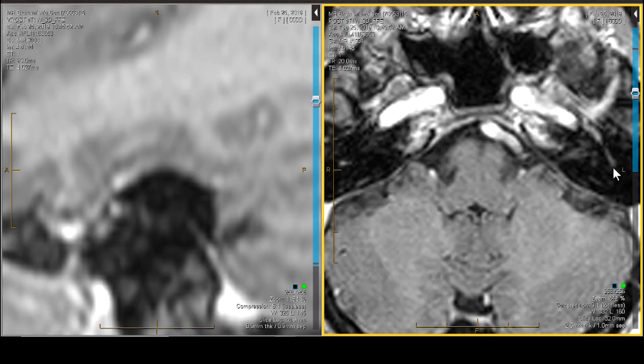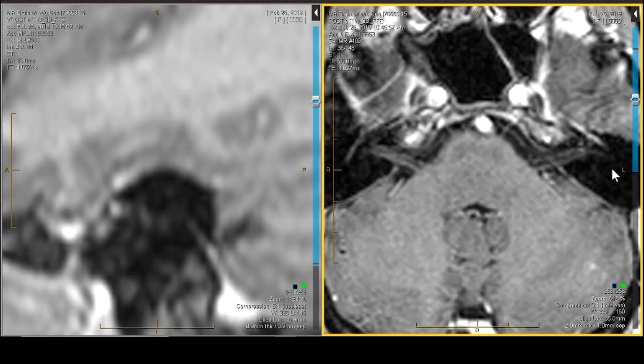Now we can't see that curve because that curve goes down into the screen as the vertical segment and then exits from the stylomastoid foramen. So we've established that there's 2 curves, one curve here at the genu with the geniculate ganglion and the other curve in the back.